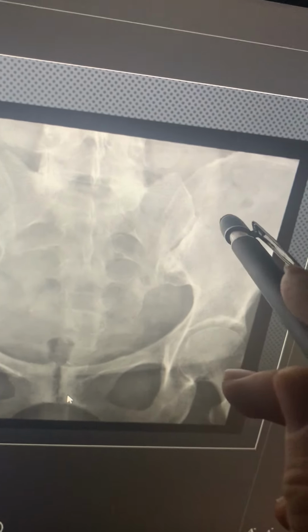And this gave us good density, good contrast. We can see trabecular markings here. We can see the outlines of the joint spaces. We can even differentiate little bits of fluids. We could even see the endings of the psoas muscles.